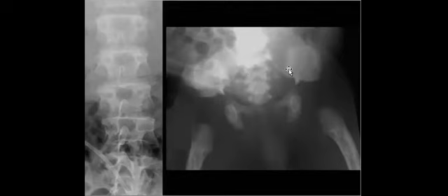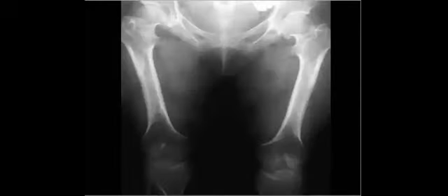What else about the acetabulum? Did anyone mention it? Flat, or horizontal, acetabulum, perfect. And the upper femur like ice cream scoops. So these criteria are all about achondroplasia, just to revise.